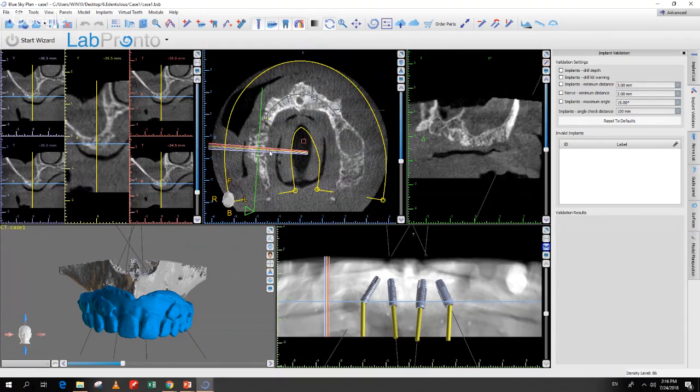We want to make sure it's integral that the denture sits properly in the patient's mouth. We discussed that if it doesn't, you're not going to have a good surgical guide, and if it doesn't, then you should realign it so that it does sit properly in the patient's mouth. But how do you know if the scan is problematic, either because it doesn't fit properly or it wasn't seated properly?